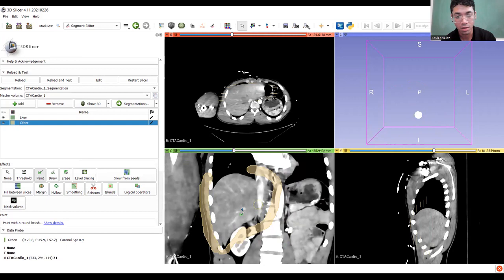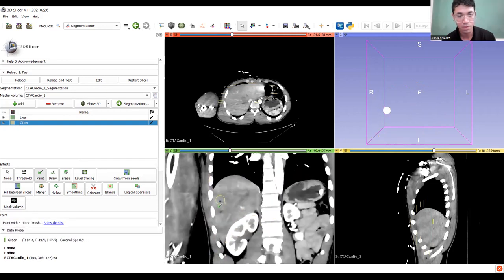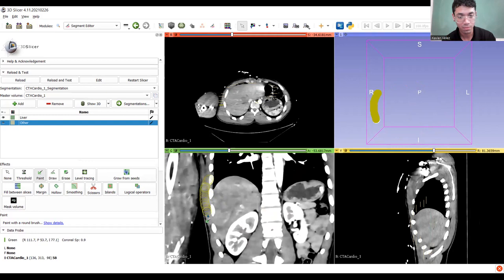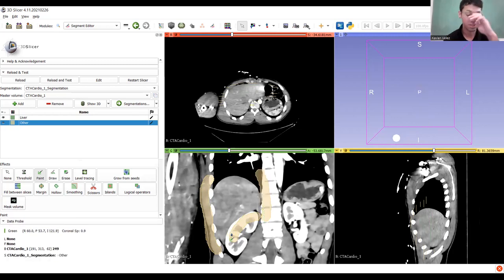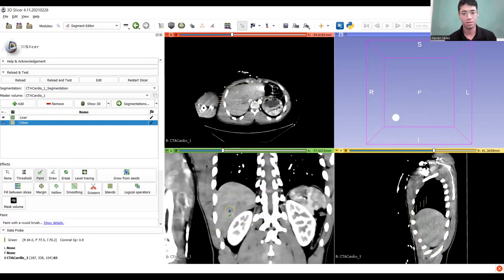Okay. And I'm just gonna continue. We're really starting to get towards the end now. Sweet. Get that kidney out of here. Spine is not kidney. Who'd have thunk? All right. That bit, that bit, that bit.